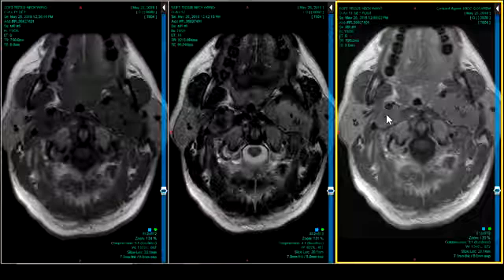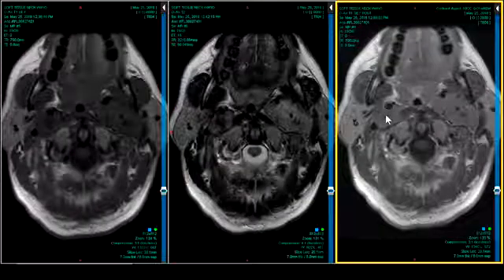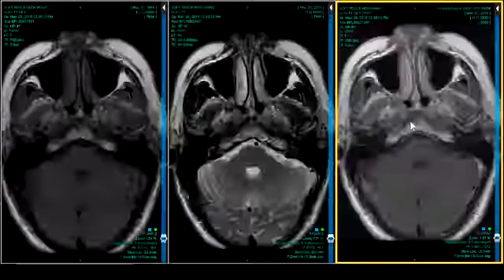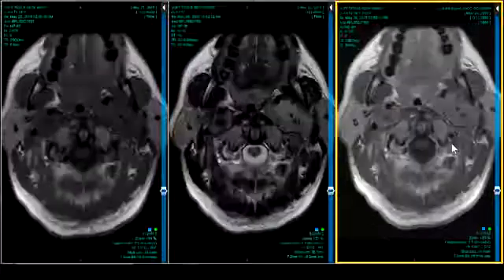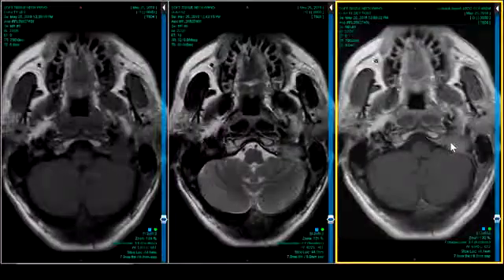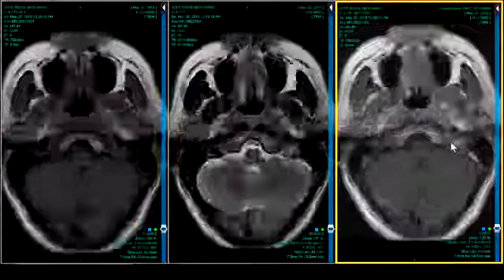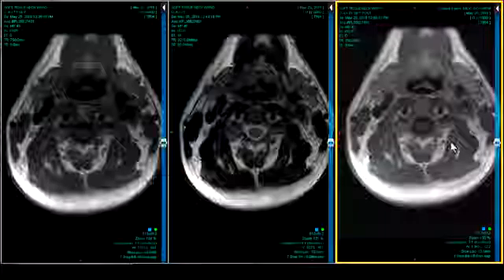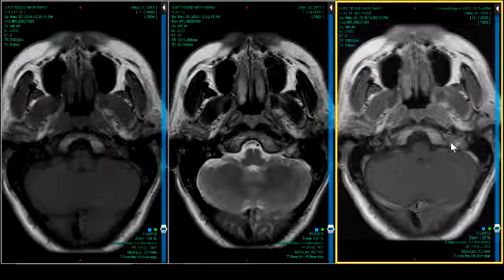And this used to be a classic sort of angio sign, in the kind of pre-CT days, you would see this with the carotid all splayed out. Okay, and then this Glomus jugulare. So you got the whole thing here, probably on both sides. Glomus jugulare, Arnold's nerve, and then Jacobson's nerve, tympanic canaliculus. Those you may find in the middle ear.